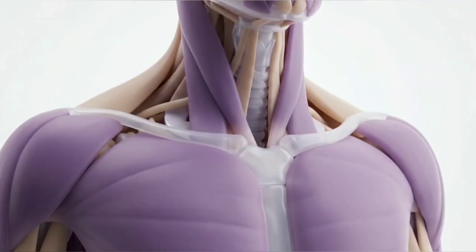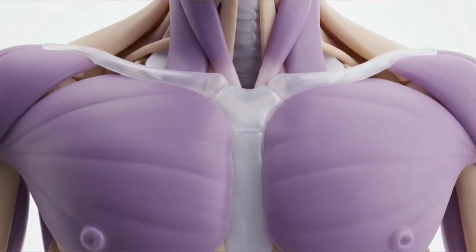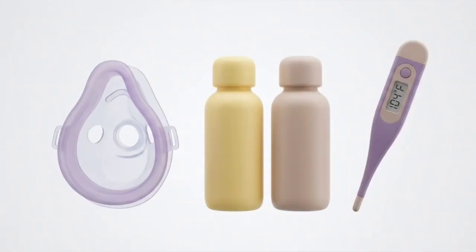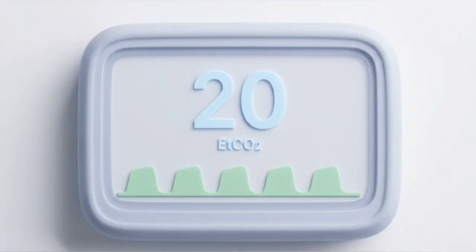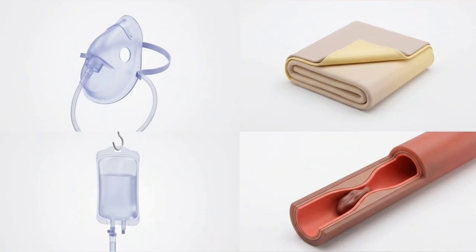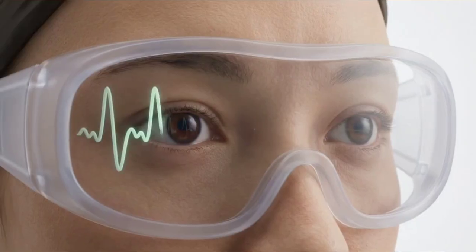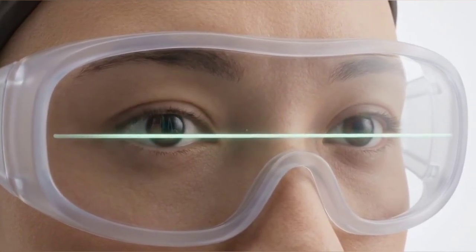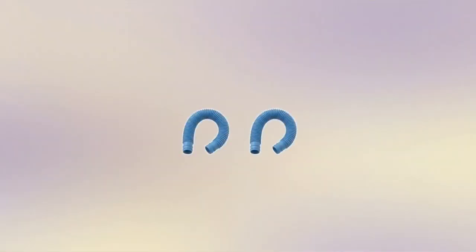If the waveform is normal but the numerical value is elevated, the patient is retaining carbon dioxide. The causes range from hypoventilation to hypermetabolic states like sepsis or the onset of malignant hyperthermia. Conversely, a normal waveform with a decreased end tidal value points to hyperventilation, hypothermia, clinical shock, or a pulmonary embolism reducing the gas exchange. If the end tidal value abruptly drops to zero with an absent waveform, it is an absolute emergency. It indicates a total circuit disconnection, complete patient apnea, or a ventilator malfunction.